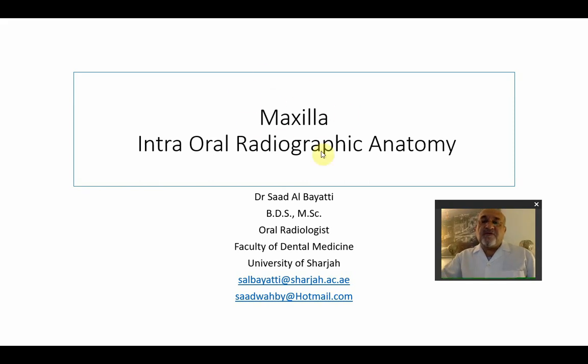And today we're going to talk about the intraoral radiographic anatomical landmarks in the maxilla.